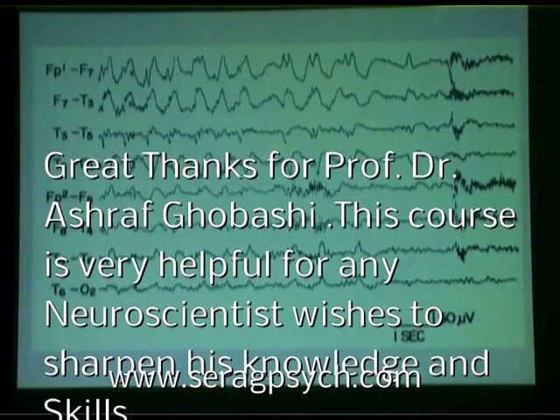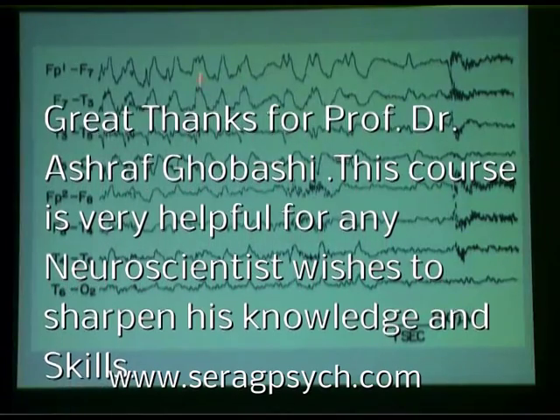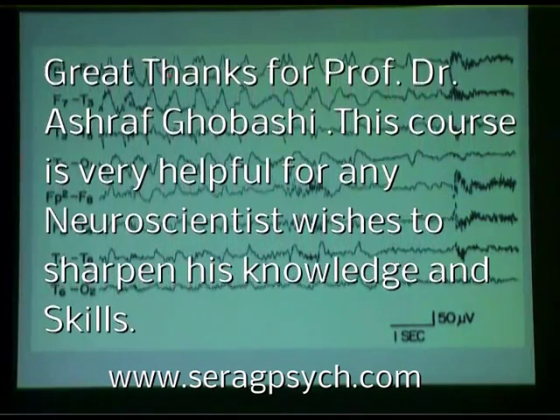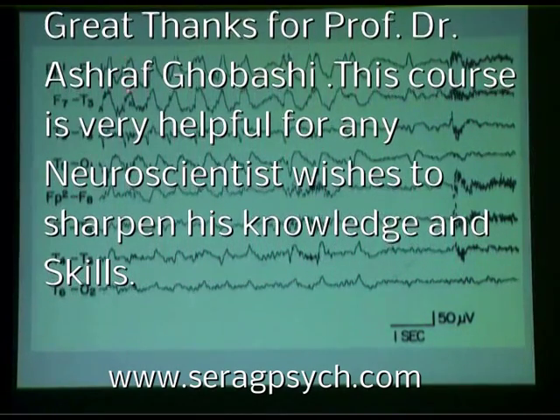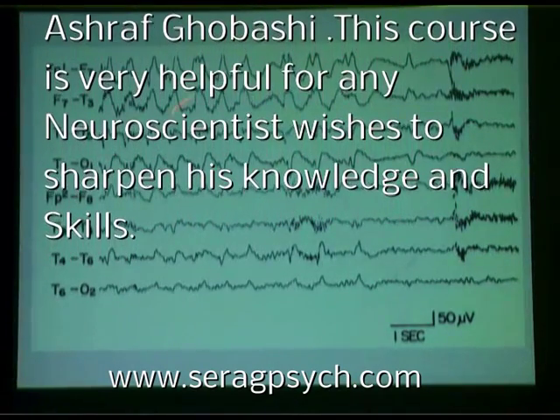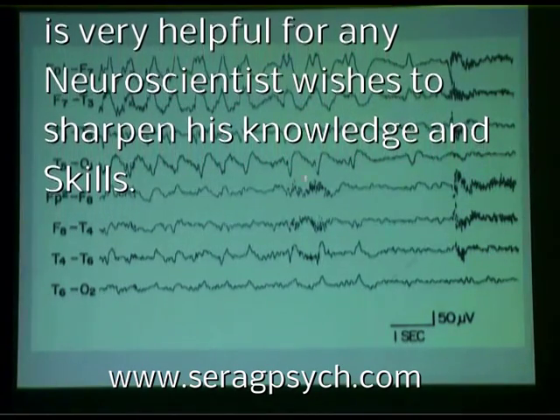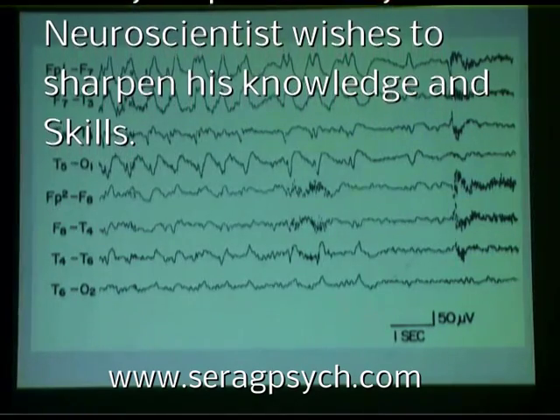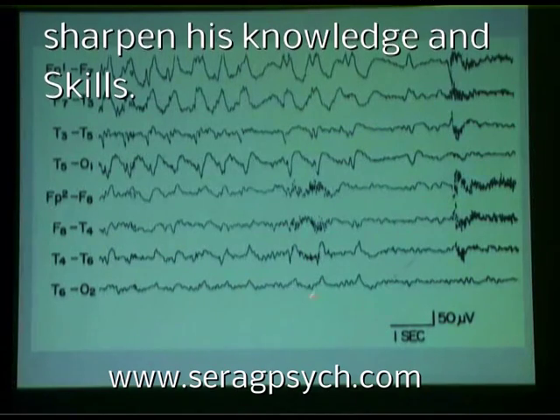Next, please. And then as the seizure is progressing and inhibition is beginning to really take over, you get a spike and then a wave, a spike and a wave, a spike and a wave. And these waves indicate that inhibitory postsynaptic potentials are becoming more and more prominent as the seizure begins to end. Notice the seizure move back a little bit. T3 cancels with T5 here toward the end. And note the moderate involvement of the contralateral right temporal lobe toward the end.